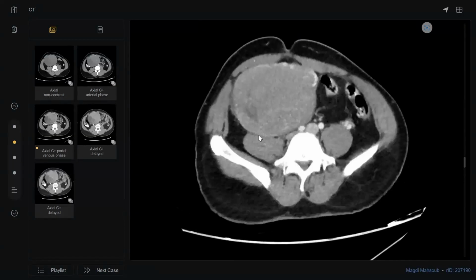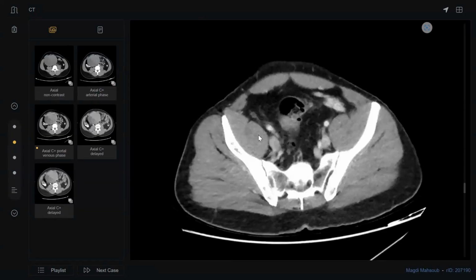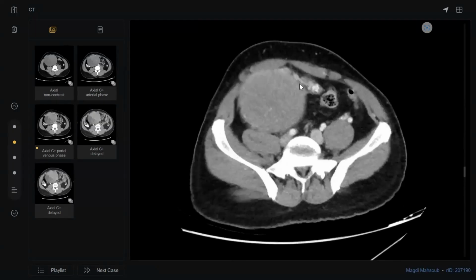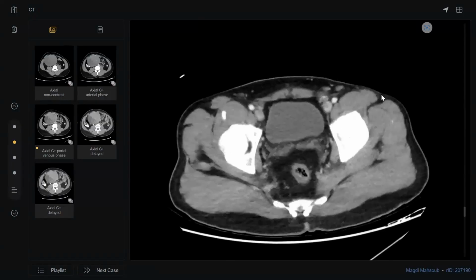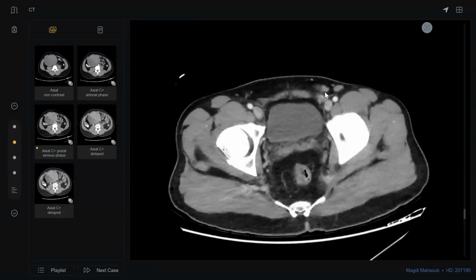This is the large retroperitoneal mass here. Look here, my colleagues. You will find this pedicle. Look here. It is connected to the inguinal region. Look here to the inguinal region. Here. By the way, this is not the undescended testis. By the way. Okay?